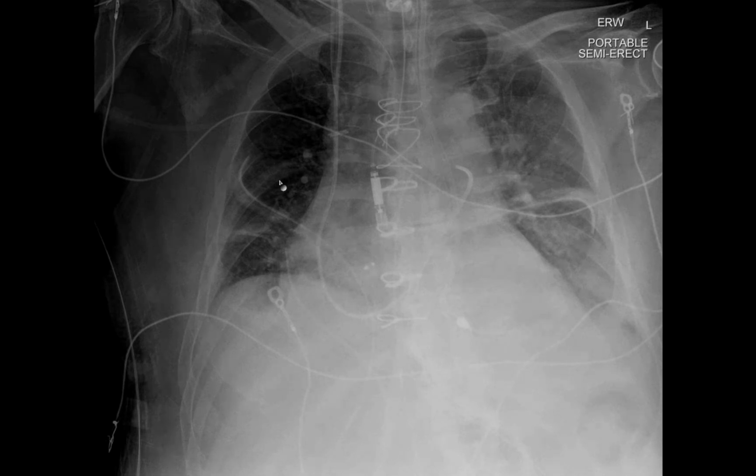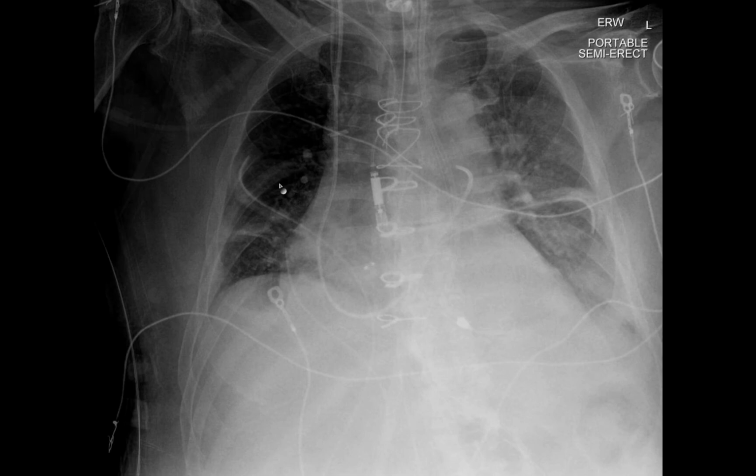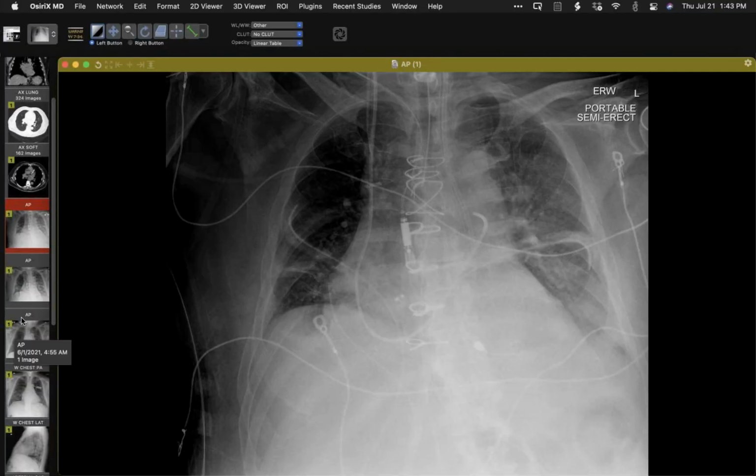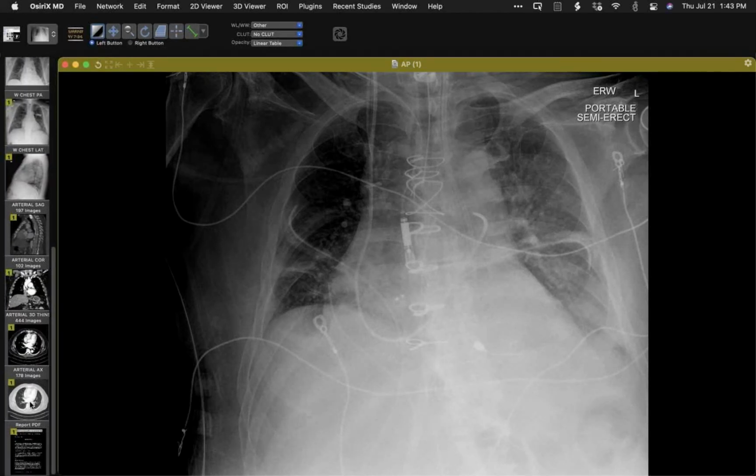Anyone see anything odd about the left ventricular impeller device? It's a direct stick into the aorta there. Exactly. Anyway, why is it coming from here? Right, exactly right. So that was taken out. That's good detective work. So you have to kind of figure out what the heck's going on here.